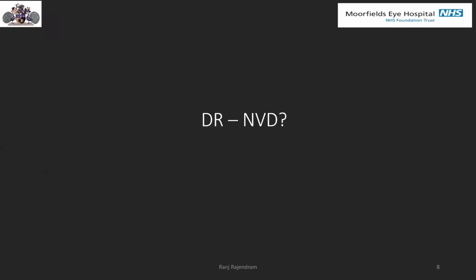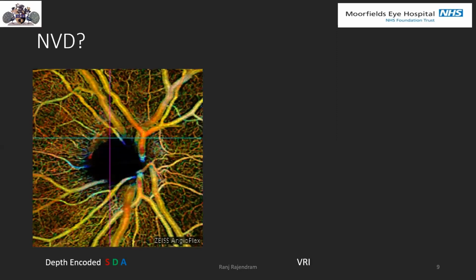So the other things to look at are proliferative diabetic retinopathy. This is always a question for us. When do the new vessels start? Are they new vessels? How long have they been there? Are they regressing? Are they progressing? So really important for us to document.